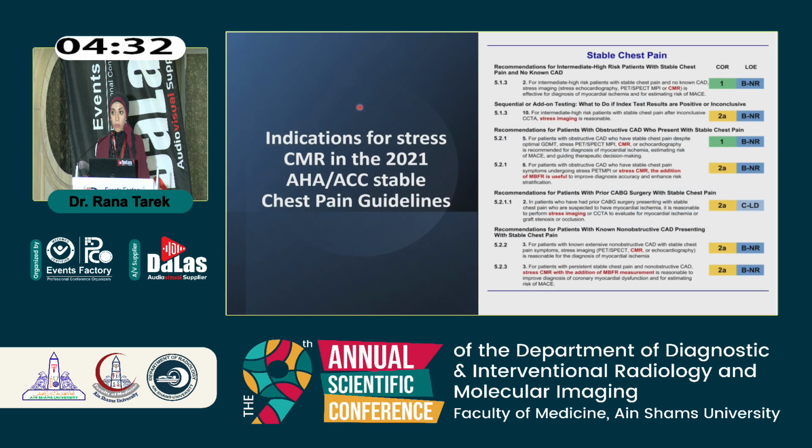And we can confirm that this is just an ischemia and not a chronic infarct by correlating with the LGE images. If we can see a scar, then this is an established infarction. If there is no scar, then this is stress-inducible ischemia. And these are the indications for the stress cardiac MRI in 2021.